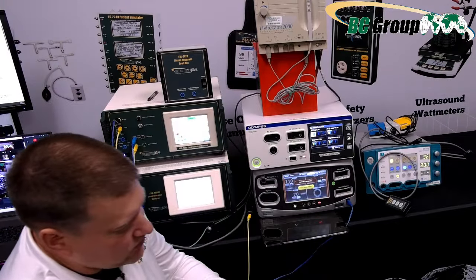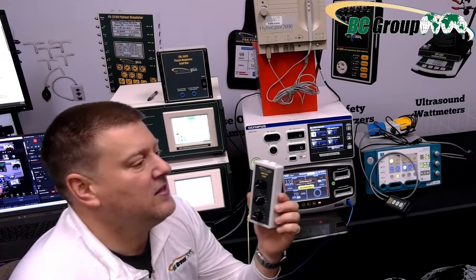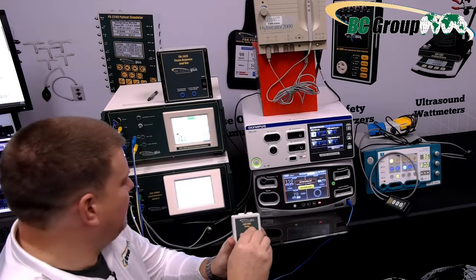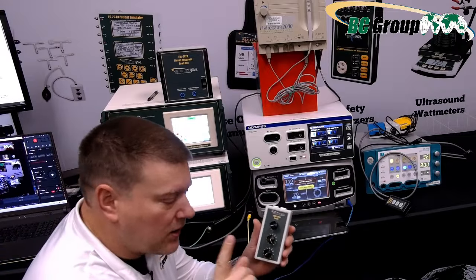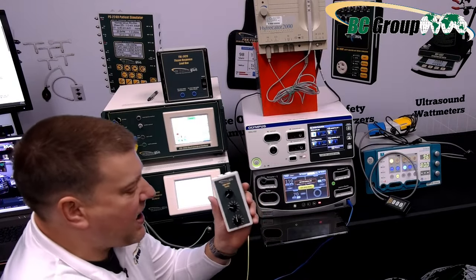The other thing I want to showcase is this little bad boy right here. What a cool device. This is a CQM tester. And instead of having a giant decade box with all these 100 flip switches, look at this. I got 3 rotary knobs. So the top one is by 100. I mentioned earlier 135 ohms. That's 100, 3, 5. Bam.